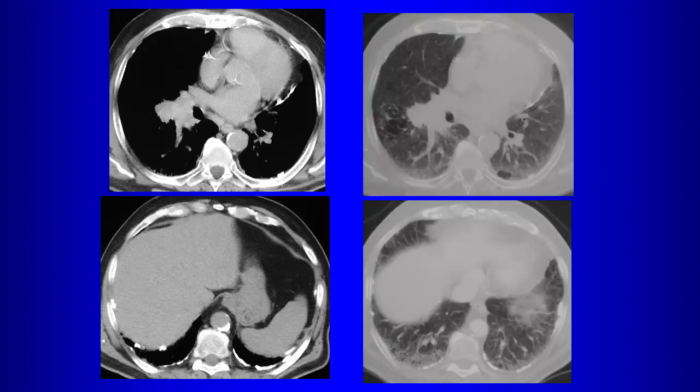Could be what? Do you think it's lymphadenopathy? Do you think it's parenchymal, or do you think it's hilar lymphadenopathy? The fact that it's spiculated suggests that it's parenchymal, right? So what do you think that is? Well, the topic of the talk is, all right, so we think that's a lung cancer, but are there other findings here that increase your suspicion that that's a lung cancer?